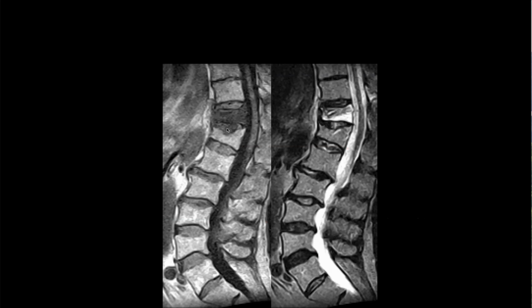And there may be some acute components here, but my guess is that there are two different ages of these fractures. At this level, the posterior cortex is intact. At this level, you have a little buckling of the posterior cortex there. And it looks like the height is decreased anteriorly here, which is not too uncommon. So this is probably an old compression fracture, which might have a little bit of a burst component to it, but it's probably an older compression fracture.